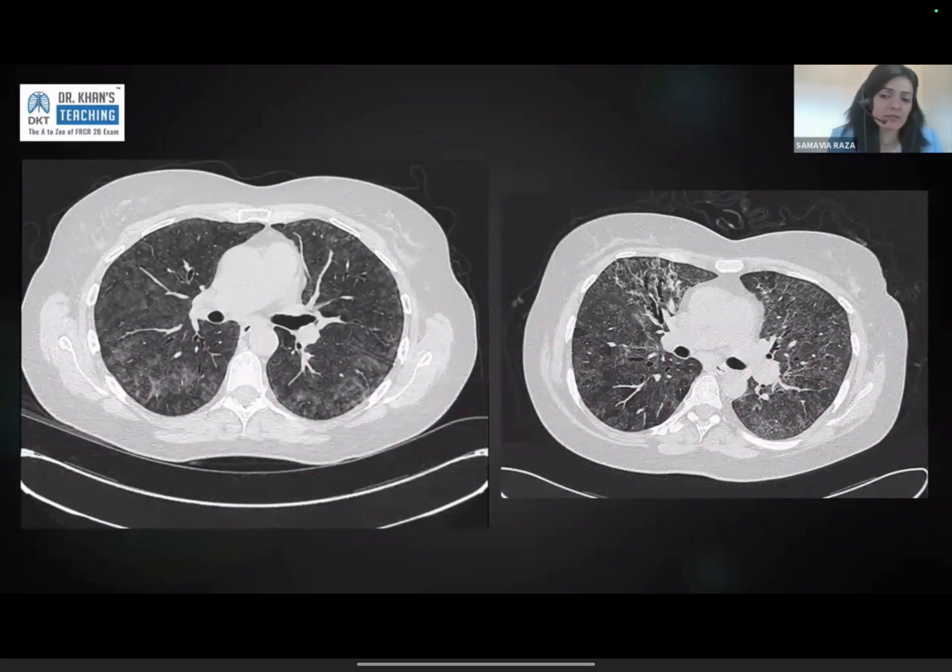Technically, at this phase, this could still be reversible. If they heal completely, that could go back to a normal diameter of the bronchus, or this can be the first signs of the patient developing chronic HP. So this is worth mentioning on the scan that there is clear evidence that this is still a subacute disease. Because for subacute HP, you want to see ground glass centrilobular nodules. Presence of centrilobular nodules implies active disease, and by active I mean acute and subacute.